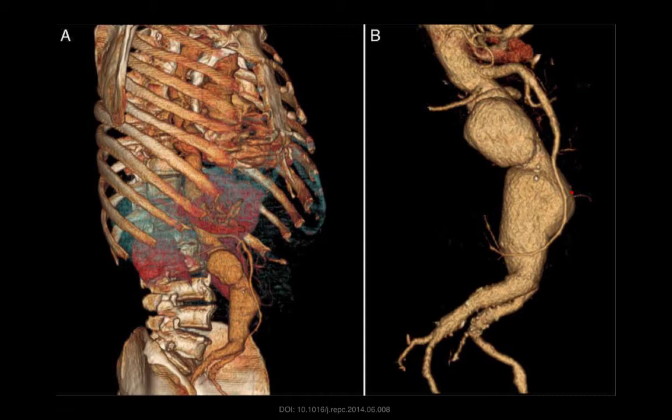It is amazing the detail at which you can see what's going on, and you can really start to understand why surgeons are so interested in getting these CTAs, right? Especially vascular surgeons, it helps them so much in preoperative planning, how they're going to attack and find the best way to fix some of these complicated aneurysms.